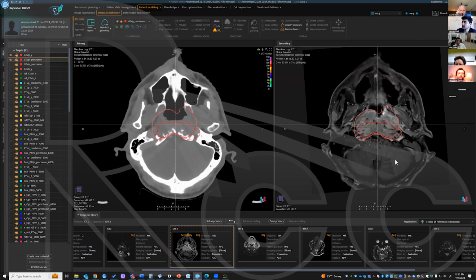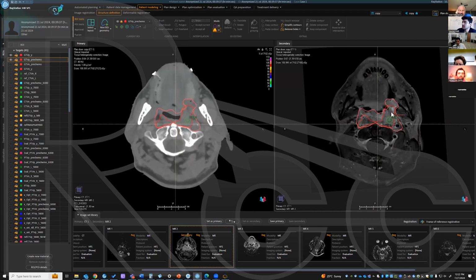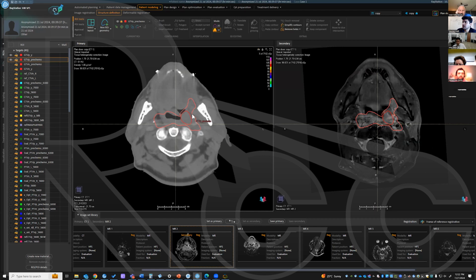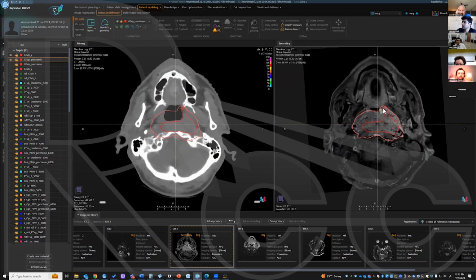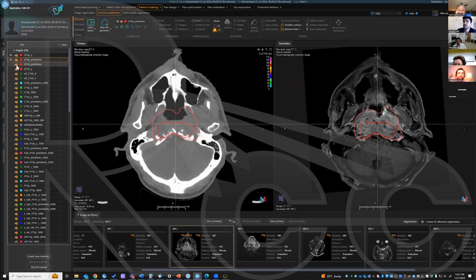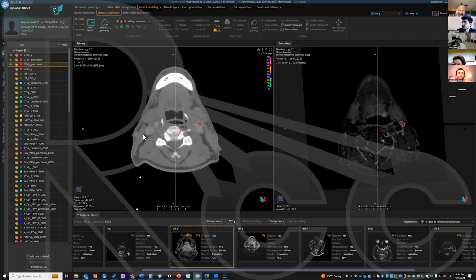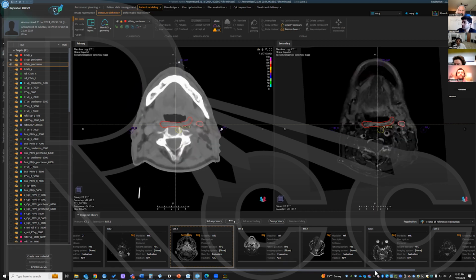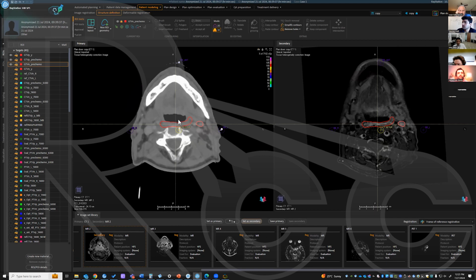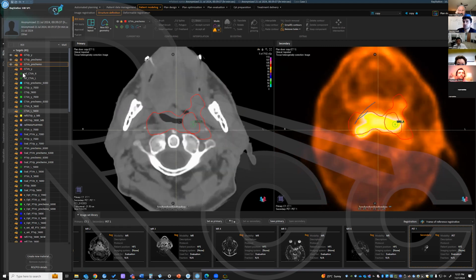It's very important, again, as we said, to have good diagnostic imaging available to help see this. The tumor extends into the parapharyngeal space almost, and as we go down, it's kind of encroaching on the pterygoids. So we need to cover all of that as our initial pre-chemotherapy GTV and pre-chemotherapy nodes. We're just going to go one by one, make sure that everything was contoured and we're happy with that. You can even switch back and forth between the PET scan and the MRI, and be confident and reassure yourself that all of the disease is contoured and covered.